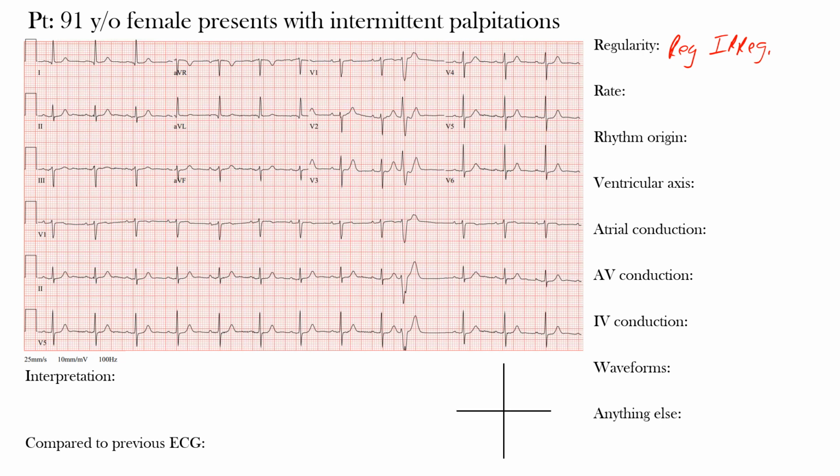So remember, the R wave is the first positive deflection after a P wave, okay? So this is an R wave here. Here we're looking at V5. So this is our R to R interval from one R wave to the next. And we're looking, is that duration between those R to R waves the same throughout? Meaning, is the next R to R interval the same as the one that precedes it, from one R wave to the next? And then we go to the next one, from one R wave to the one that follows it, and then throughout this EKG.